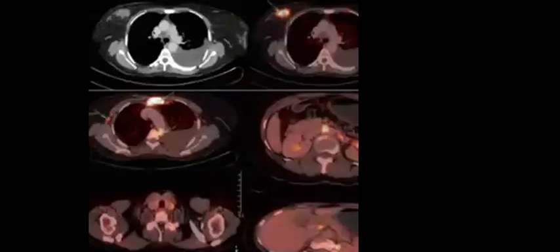In some patients with initial staging, it could be beneficial to do PET-CT, especially if there is a machine present for this in your center or in your hospital. It will be beneficial, especially in the patient who has advanced breast cancer or is suspected of metastasis, as in this case. So clearly you can depict here and here that there is abnormal uptake that corresponds to metastasis.